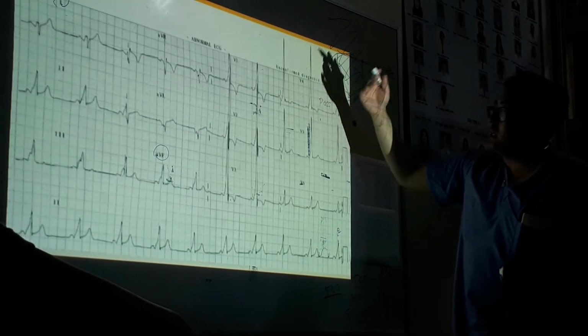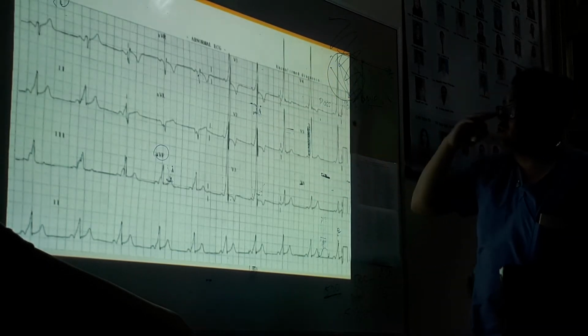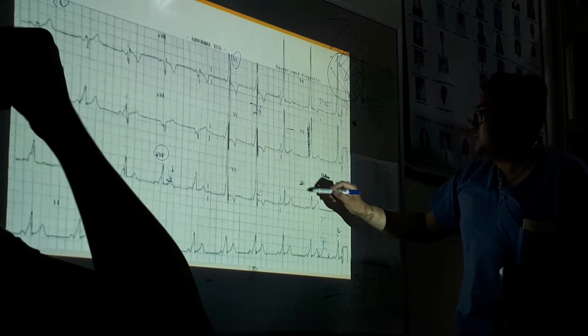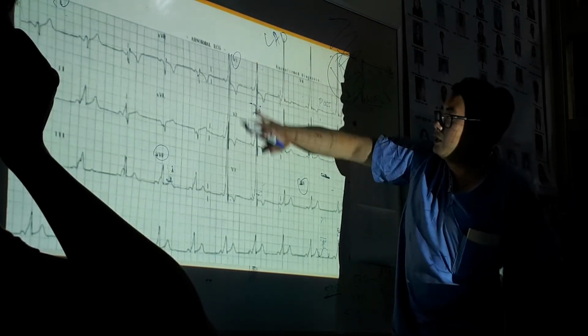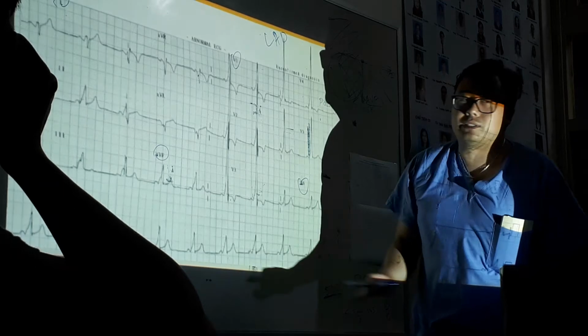And then the last thing that I look at is ST depression and T wave inversion. I look at it together, and I look at it in the leads with distribution for the blood. So V1 through V6, you think LAD. Okay, so you look at all these together. You look at 1 and aVL together, and then you look at inferior leads all together.